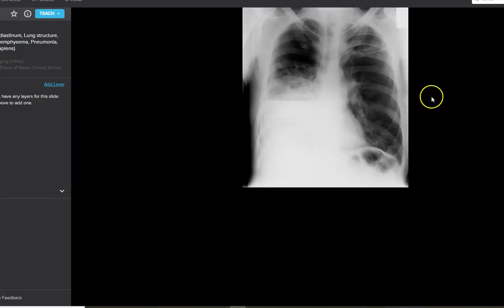I won't be able to see that so much. It's just off the side of my screen. So I'd say that's a bit of a pleural effusion, but there's some bullae in there too. So that pleural effusion needs draining, but we'd be limited to what treatment we could do because of these bullae.